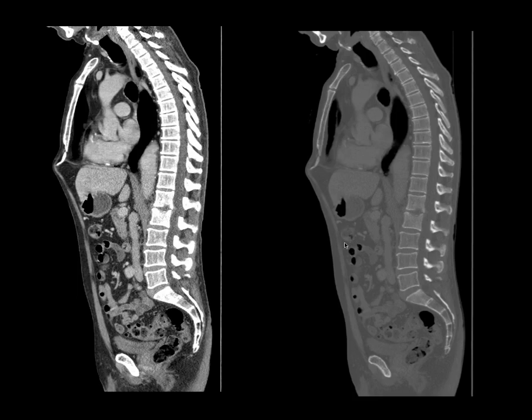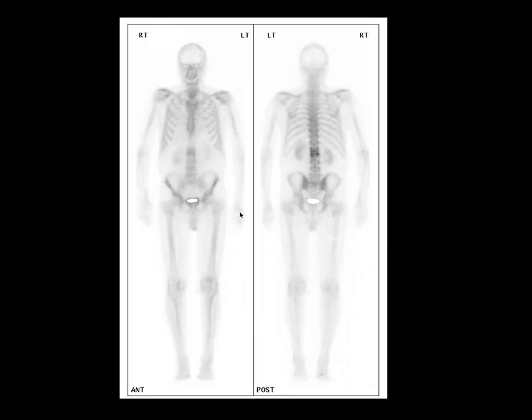But you will see these things incidentally or on bone scintigrams where patients are sent for back pain, query metastases, and you have to be able to recognize them. So there is no classic appearance on the scintigram, just this area of increased activity, but that's what it turned out to be in this case.